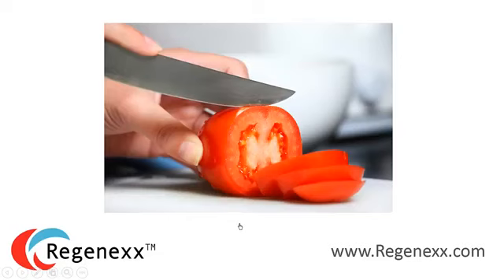And again, as you look through an MRI, you have to understand that you're looking at slices of an image. So you have to get a sense that you're looking from front to back or left to right, and you're looking at individual slices as you march across the structure.